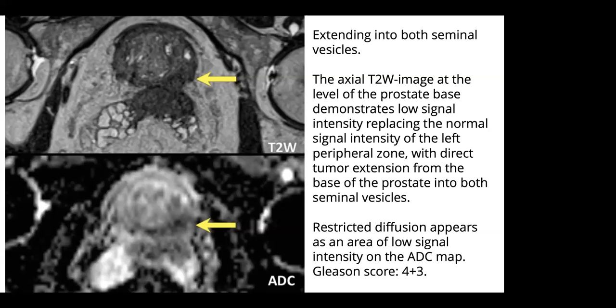And if we see that the disease burden is more on the left side, so this is suggesting infiltration into the seminal vesicle of the prostatic lesion, which on ADC mapping is again showing low signal or hypointensity with areas of marked hypointensity within it. So this is another example of local extension of the prostate cancer into the seminal vesicles.